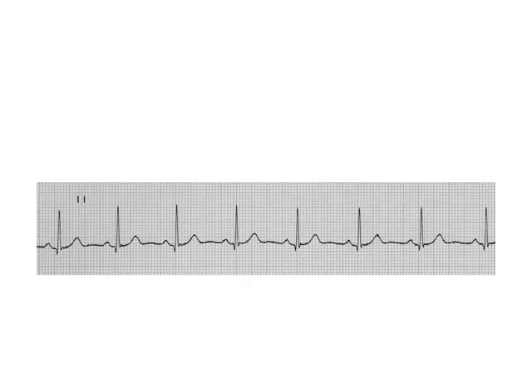Okay, let's have a look at some ECGs. I'd like you to pause the presentation now and, using the rhythm strip in front of you from lead 2, calculate the rate of this ECG.